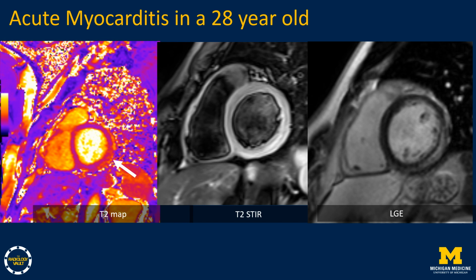Now, if you were looking at the case, you weren't quite sure, and you wanted to confirm this delayed enhancement, what you could do is obtain a three-chamber image. And knowledge of these myocardial segments and the anatomy really helps you decide which plane to obtain.